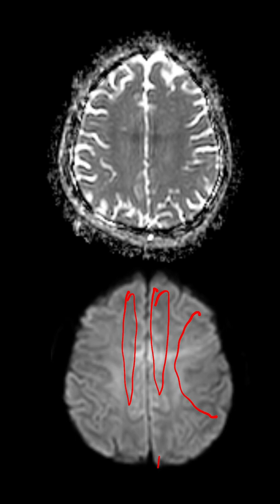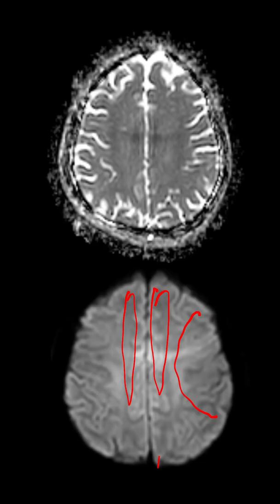Understood? If there are infarcts in any of the 3 territories, then you have to decide whether the patient needs treatment or not. Here the new MRI which is done does not show any new infarcts, and hence what should be the treatment? Best medical treatment. So ideally the patient has not progressed much. The symptoms are also very minimal. Maybe you can change the antiplatelet regimen to a newer antiplatelet like ticagrelor and keep the patient under follow-up. What do you think is the risk of this patient developing a stroke? Much lower.